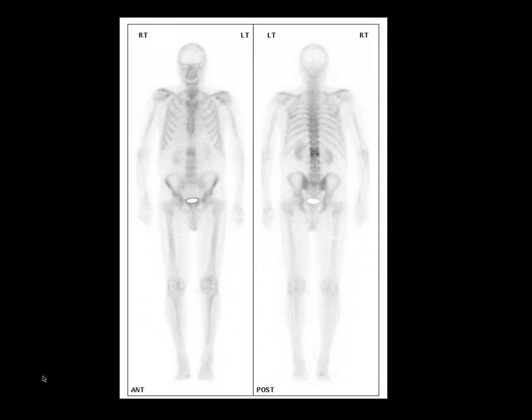scan. So this bone scan, things generally look okay, but of course I'm sure your eye is immediately drawn to this vague area of increased activity in the upper lumbar spine. And what's that? It doesn't look like classic degenerative change. It doesn't look like a wedge compression fracture, but of course there's no use in radiology in saying what things aren't. We've got to say what they are.